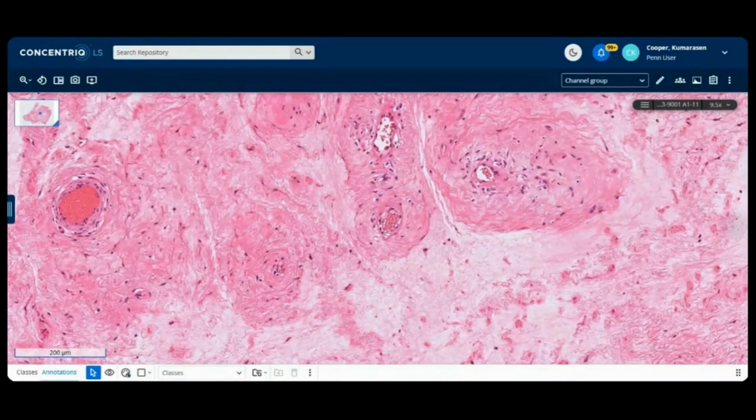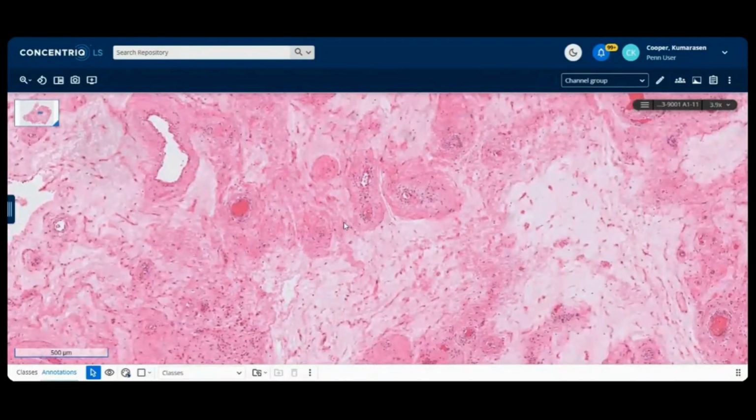Heba, angiofibroma. Angiofibroma, you have to qualify. Yeah, you can get soft tissue angiofibroma, and then you can get the cellular angiofibroma. So I'm hoping you're thinking of the cellular angiofibroma, because then this would fit into that lower GYN tract mesenchymal tumor. That's my coined term. I like to use that because it reminds me that these tumors like cellular angiofibroma, angiomyofibroblastoma, myofibroblastoma, and angiomyxoma occur in the lower female genital tract. And I'm saying female with some caution because this is a male. So that's the reason that this is, did I say male? No, I beg your pardon.